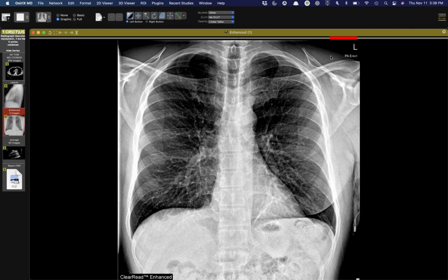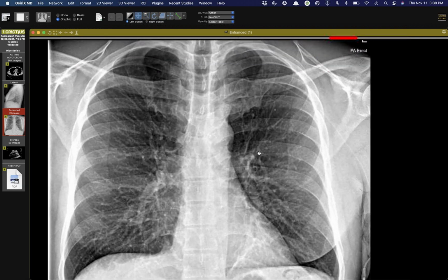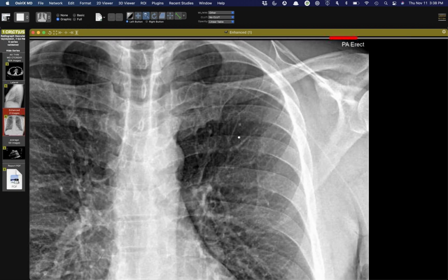All right, you see a radiograph here? Yep. So this is credit to Paige McAdams, because I have never made this observation or even thought about this as being diagnosable on a radiograph. This is from the other day. I don't know what type of PICC this is. It's a little bit smaller caliber than what we typically see. But Paige noticed that it had a bit of a tortuous route there.